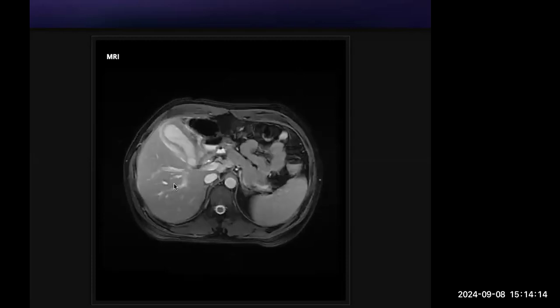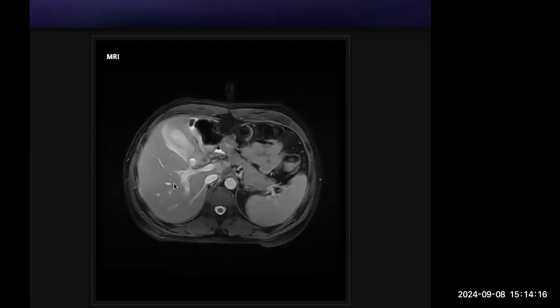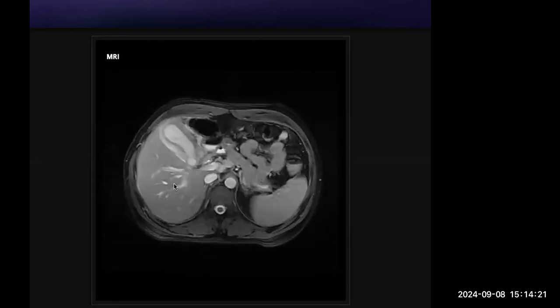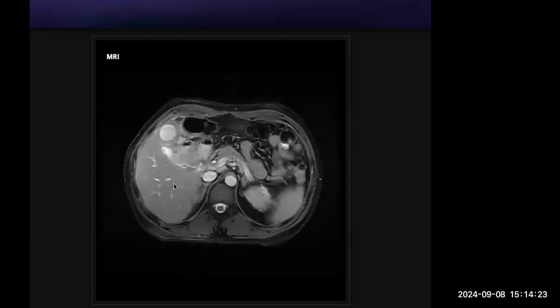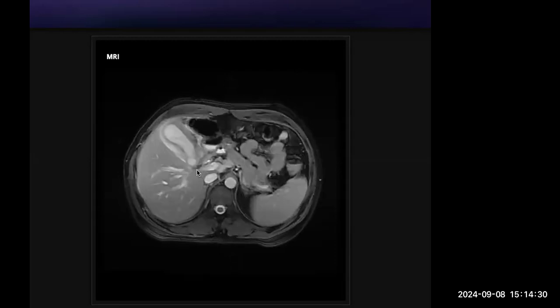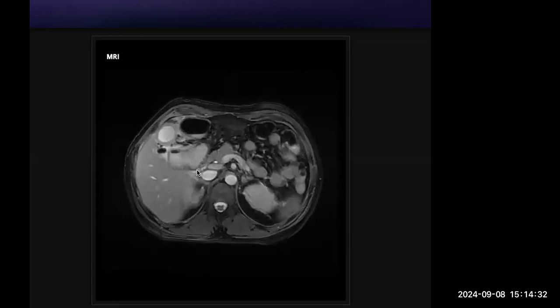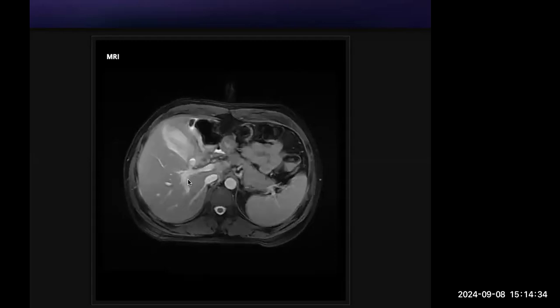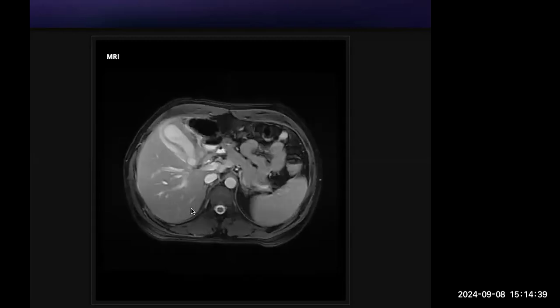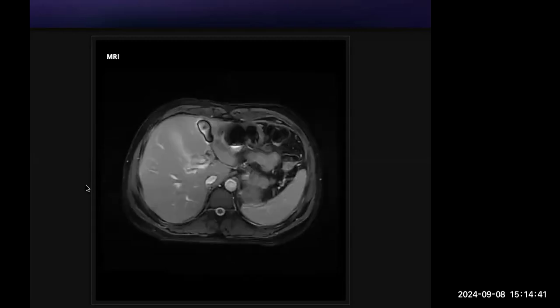This wall thickening is circumferential. There are no focal areas of thickening that I can see, which would point towards a focal lesion. Though there is some soft tissue associated with this, which is extending inferiorly towards the hepatic flexure. In my routine practice, I would confirm that on the coronal or other orthogonal planes. I can give you the coronal.